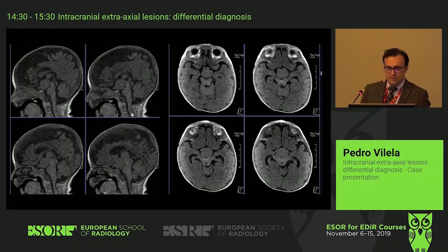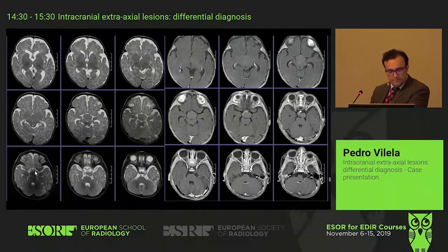So reviewing anatomy, the spinal cord, the medulla, the pons, the midbrain, the floor of the third ventricle should be like here. So you have something that is not intrasellar, it's suprasellar, and probably it's based on the floor of the third ventricle, where is the hypothalamus. Okay? And clearly you see here the lesion. Again, the lesion here, here, and we give contrast. It's not cystic, it's actually very solid, but we give contrast and there is no lesional contrast enhancement.